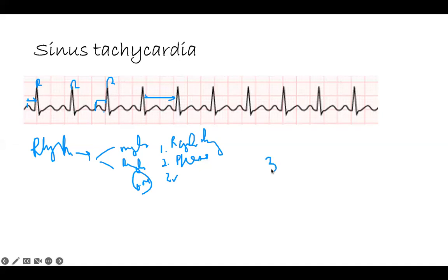So 300 over, and this is almost like here, 300 over 2.5 or 3. So that's like over 100. Okay. But this rhythm, 1, 2, 3, it may be 6 seconds. I pick it up. It's a little bit too slow.